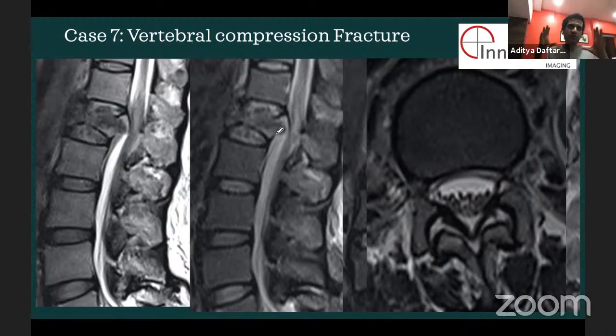So just to keep your mind alert, when you see vertebral compression fractures, oftentimes you guys have the history, so you know what it is. For us, we just get vertebral compression fracture, please deal. Tell us what you think. One may forget to look at the posterior elements, one may forget to think about these things, and sometimes these findings can be a bit subtle.